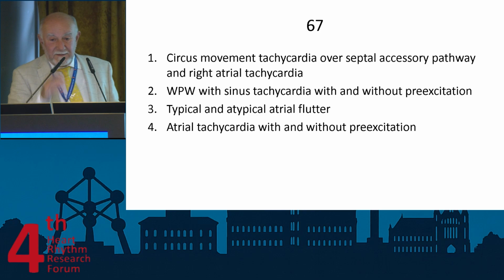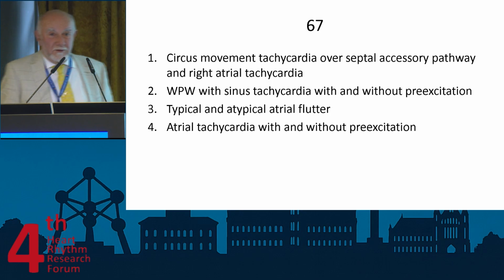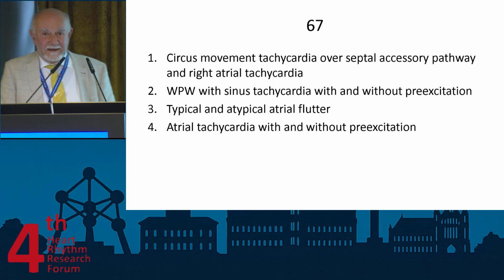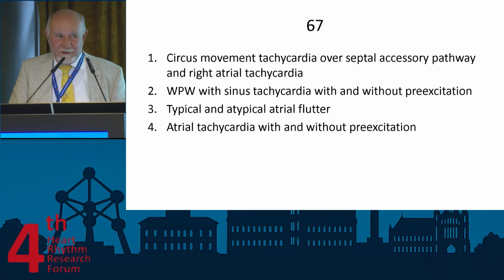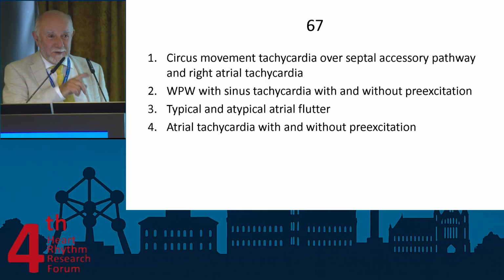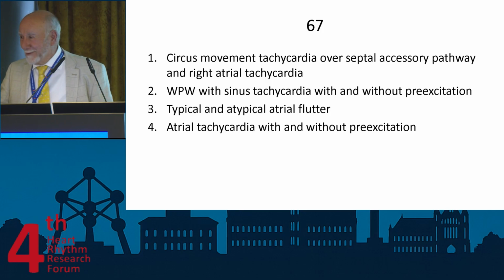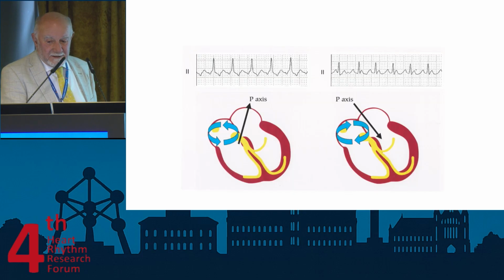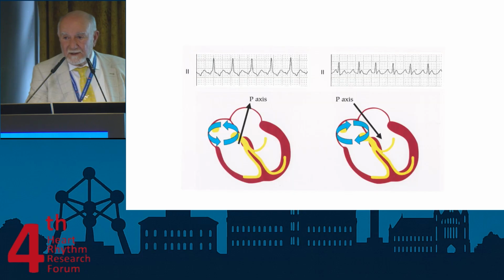So what do you think? What is your vote? Who thinks it's 1? Nobody. 2? WPW? Nobody. 3? Typical and atypical atrial flutter? Okay. Well, okay. And then atrial tachycardia with or without pre-excitation. Okay. The ones that did not answer cannot go to the next one. It's because some people may wait to the last slide. So, okay. So now, I'm sorry, but that's the rule of this game. Okay, this is indeed a typical and atypical atrial flutter without any doubt.